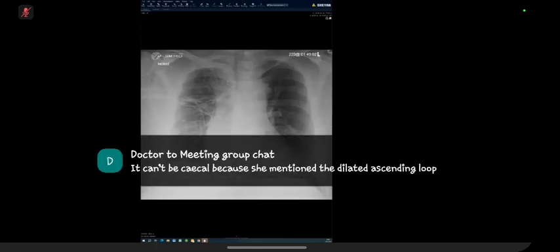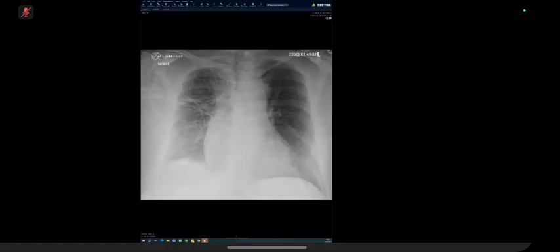This is a frontal radiograph of the chest of a patient who is in heart failure. I see that there's no pneumothorax, pneumomediastinum, or pneumoperitoneum. I see there are multiple external leads and midline sternotomy sutures are seen. Then looking at the lung fields, there are prominent vascular markings. There is cardiomegaly, there is unfolded aorta.